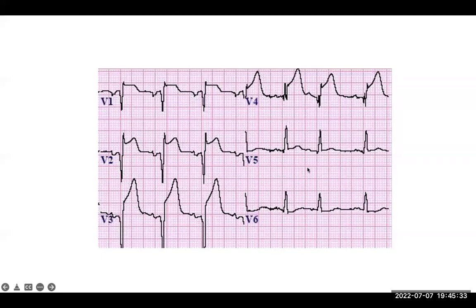Now, when you look at this, this is lead V1, V2. Of course, you can see it's going all the way to V3, V4. And as you can see very clearly, you cannot miss ST segment elevation because this is our isoelectric line, where my arrow is. You can see this pattern is called QS, the T wave is here, and all this is elevated because it's supposed to be around this region. This is very clear, nobody can miss this. So this is anterior because it's covering all the way from V1, V2, V3 up to V4. This is what we can call anteroseptal or anterior MI.